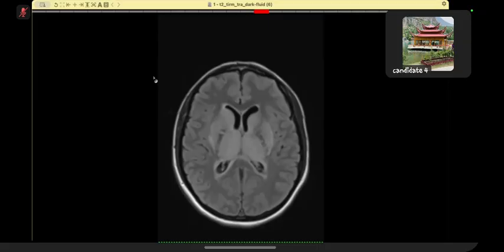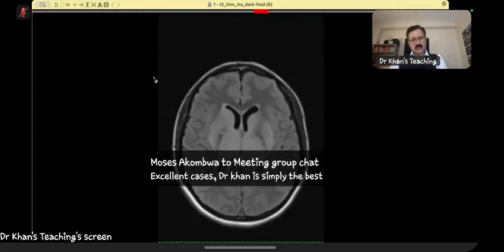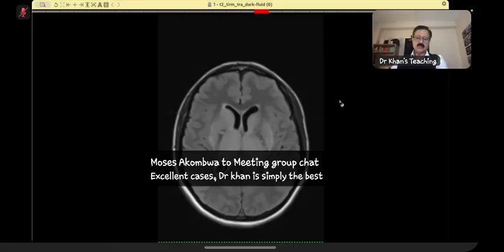Sir, I have been presented with the MRI. Sir, these are scrollable images. Yes, yes. You can ask for the mouse.